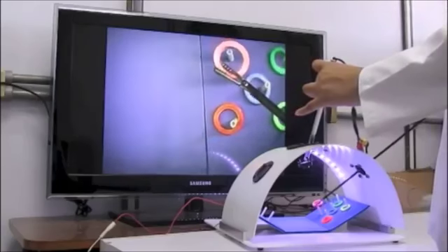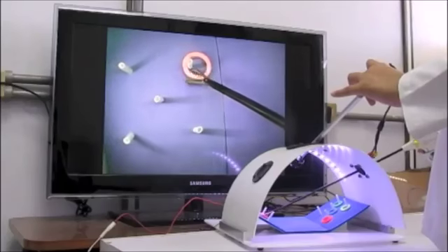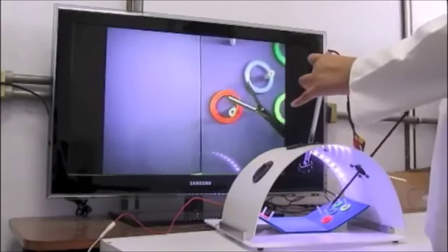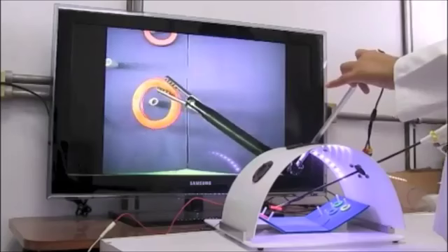In the transfer task, the surgeon must transfer 5 rings located on a work plane angled 30 and 150 degrees to the horizontal plane. In order to move each ring, the surgeon must manipulate the optics by moving the instrument in order to avoid the instruments going out of the field of vision.